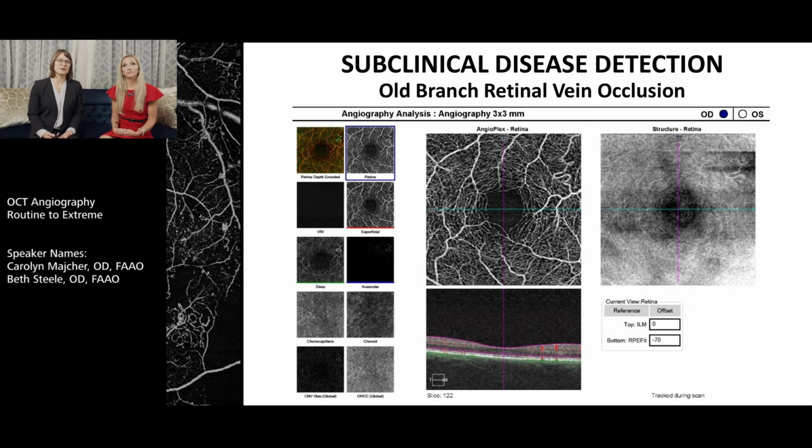And of course, you can correlate that with the data otherwise for the patient at hand. I really love this example. I mean, there have been so many times where there's been really chronic, old, long-standing, even small, like twig branch retinal vein occlusions, and the findings can be so subtle. And here, OCT angiography really highlights that for you. So if you have a case of unexplained acuity, you may be able to explain it by doing OCT angiography when your clinical exam was lacking.